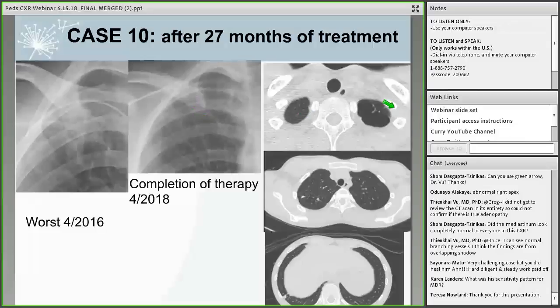So that's really good. And then the CT post-treatment, I mean, you can see a little bit of scarring on the left side, which we didn't really appreciate on the chest radiograph. But on the right side, you can see there's an area where it's maybe a small nodule in the right upper lobe, as well as maybe a non-specific nodule in the right lower lobe, which we didn't see on the chest radiograph, so we can't really evaluate that. But still, clearly no cavity or small consolidation or anything like that in the right upper lobe. It looked like this is just post-treatment changes.